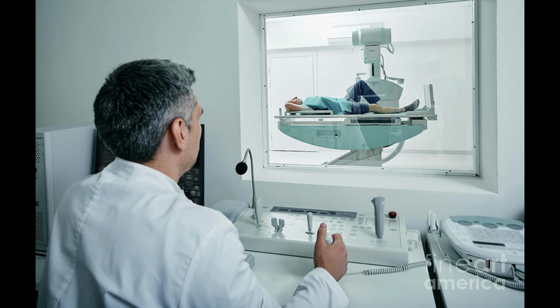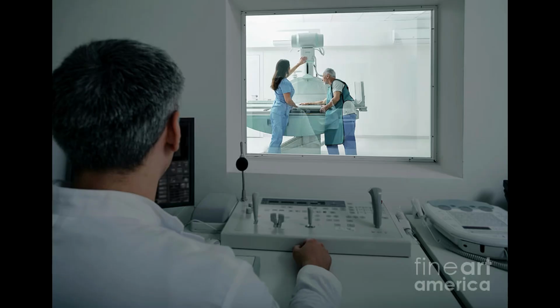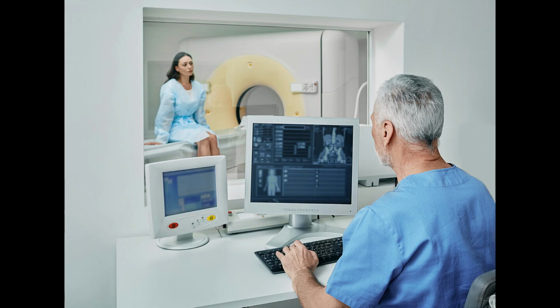10. Control Room. The control room is where decisions are made and the entire imaging process is managed. From this room, the technologist selects parameters, sets the anatomical program, activates or deactivates the AEC, and reviews the image preview. On the console, you can see the histogram and exposure index of the image, which indicate whether the image exposure is within the appropriate range.